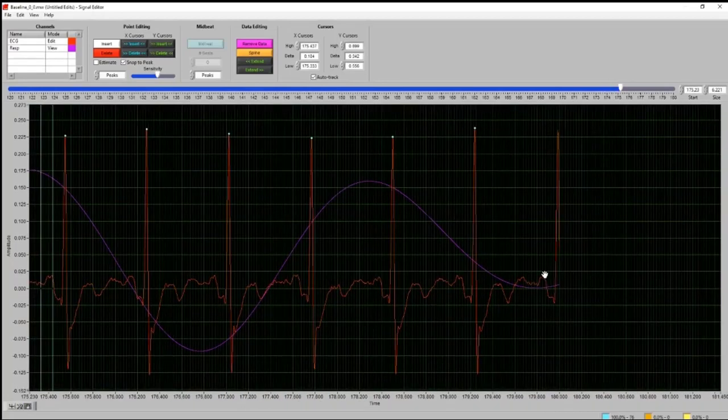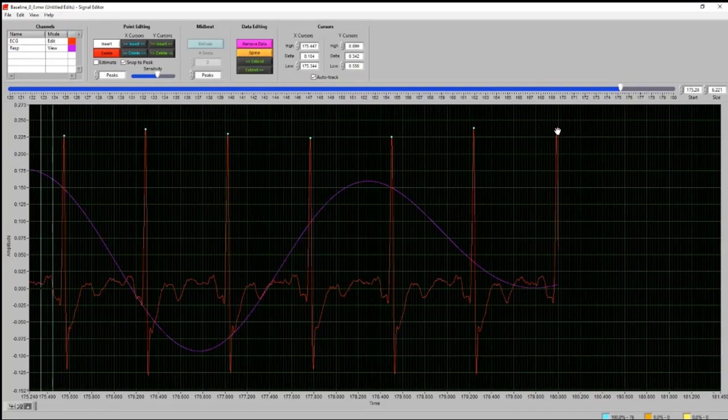So in this case, we actually have what looks like a really good beat. We could use our timing X cursors, and we can just visually see it looks like the timing is correct. But what's happened here is this beat is incomplete, so the software is going to say that it's happening between these segments. And so in this case, it's not going to place the beat anywhere. And again, that's not usually enough information to really worry about.